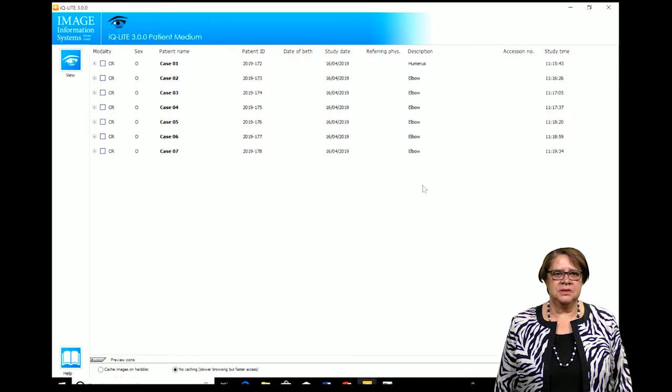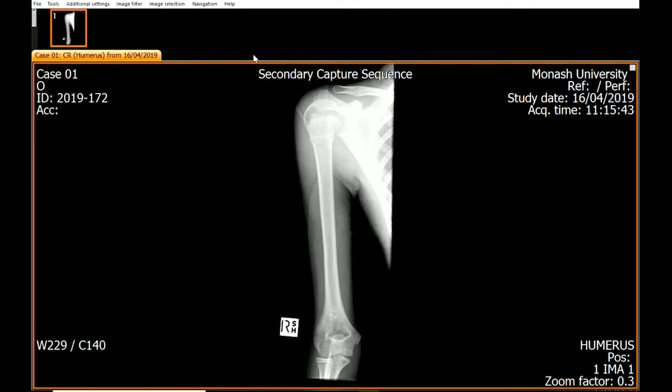With this presentation, I'm going to give you feedback on the practice bank of the humerus and elbow. I trust that you've worked through the practice bank and that you have your form ready so that you can self-mark your responses. Okay, for case 1, we have a patient who fell onto the shoulder with limited range of movement. I only have the AP view of the humerus.